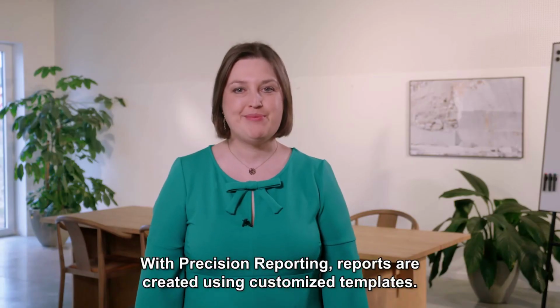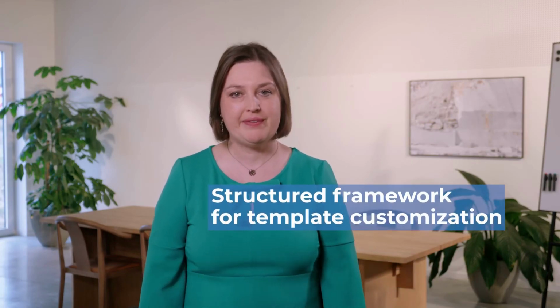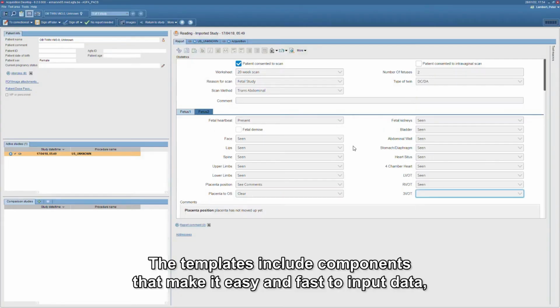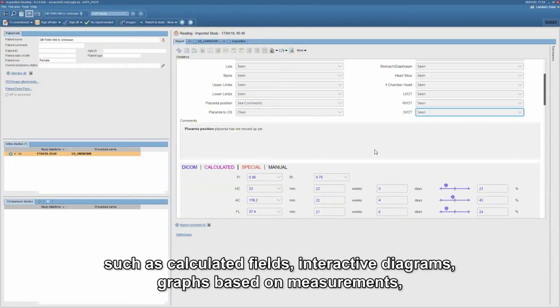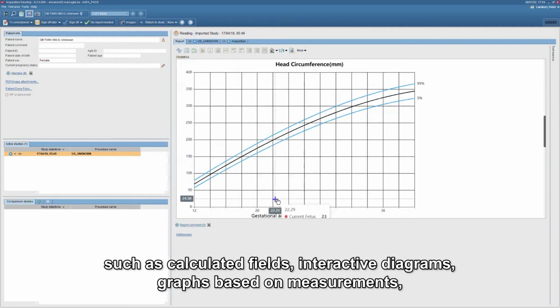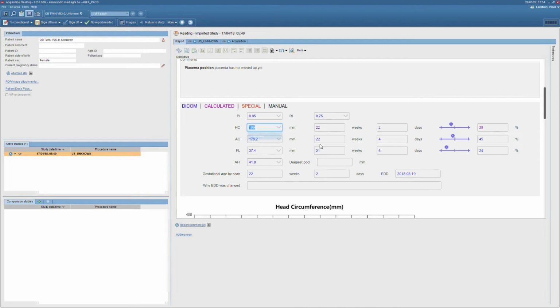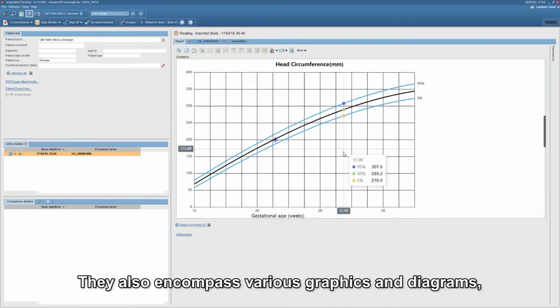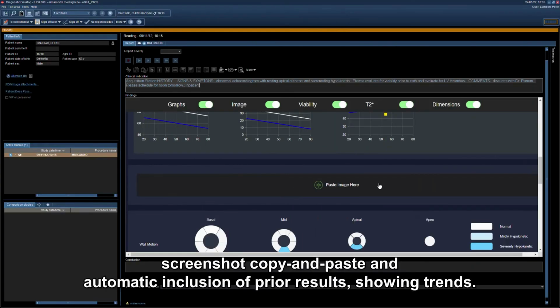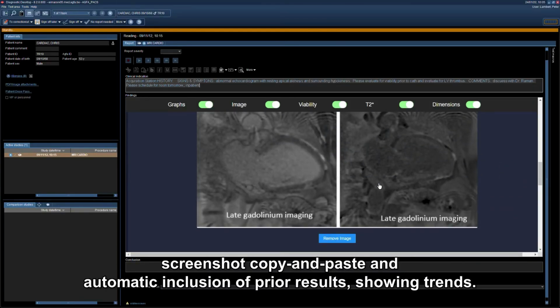With Precision Reporting, reports are created using customized templates. The templates include components that make it easy and fast to input data, such as calculated fields, interactive diagrams, graphs based on measurements, and data fetched from external sources. They also encompass various graphics and diagrams, screenshot copy and paste, and automatic inclusion of prior results showing trends.